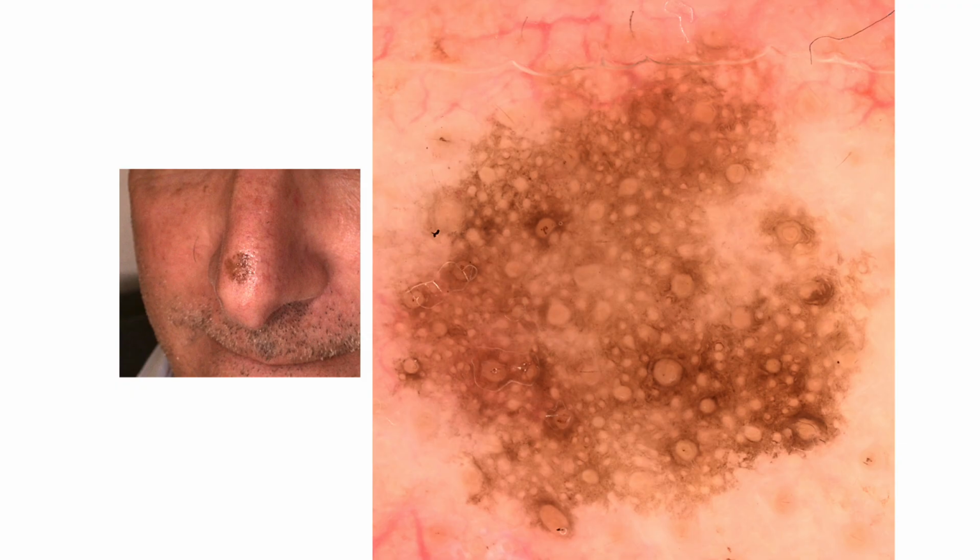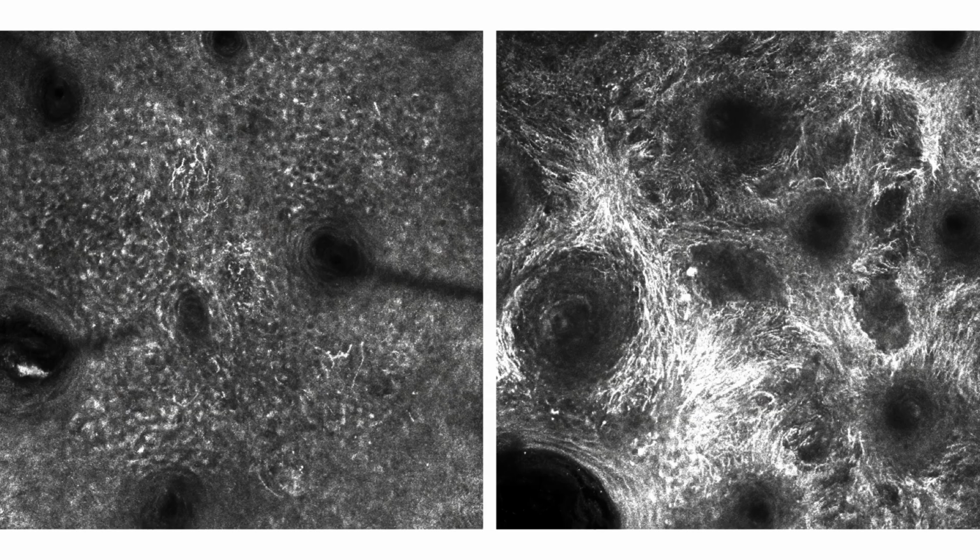But since the patient underwent a previous laser treatment, this can also be related to the inflammation process, right? So in this case, what we should do is monitor the patient after the laser treatment and try to understand whether we need to perform a biopsy. Of course, we can move to the confocal microscopy, and here again we see the presence of these dendritic atypical cells, which are located around the hair follicles and also in the interfollicular areas.